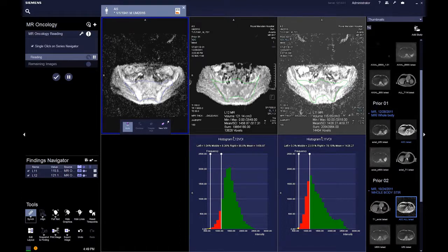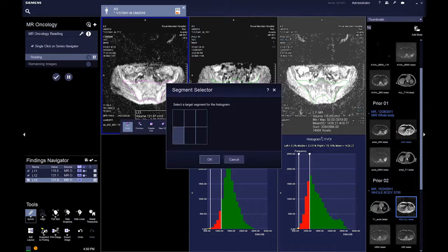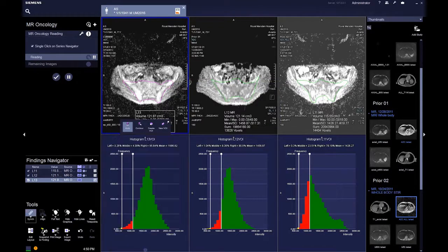This can be obtained by selecting MPR thick in the selections. Then you click Create VOI, and here we are. We have now the histogram we wanted. We can choose where we want to do it. So just to illustrate, here is the MPR thick, which allows you to do these assessments in sagittal, axial, or coronal.